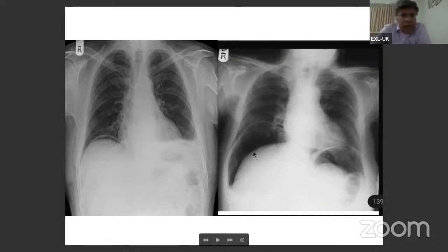This is about abdominal changes on X-rays. Being a clinician, chest X-ray and abdominal X-ray are all valuable to me. You can see this is an erect X-ray, and it's very clear: there's air under the diaphragm there. And there's the X-ray on the right. It does look like a bowel loop there, doesn't it? To my eye, especially on the left side below the diaphragm, it looks like a bowel loop to me. So I wouldn't have said so unless you look at the patient clinically.